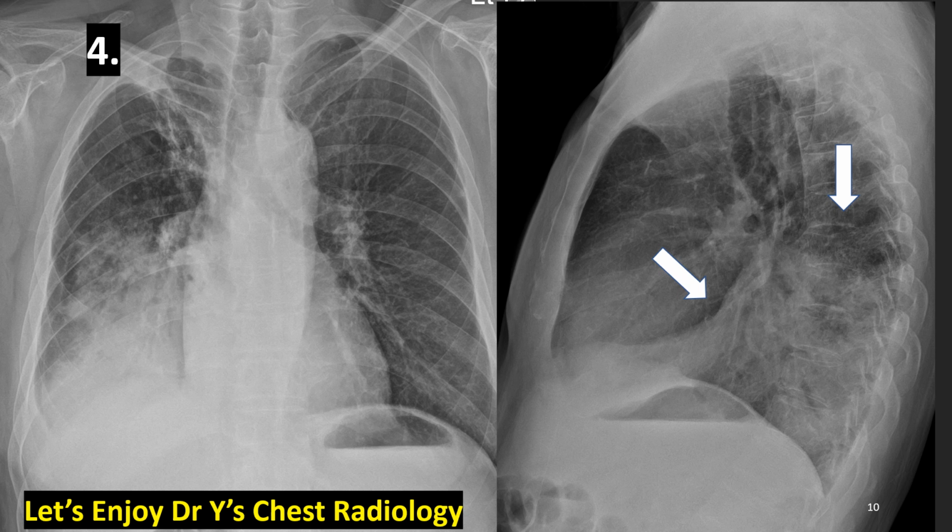We see the frontal side margined by the right major fissure. And also we see the top portion of the right lower lobe is okay, disease-free. That means the superior segment is not involved in this lung cancer collapse.